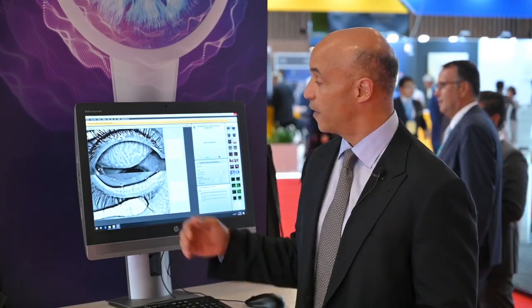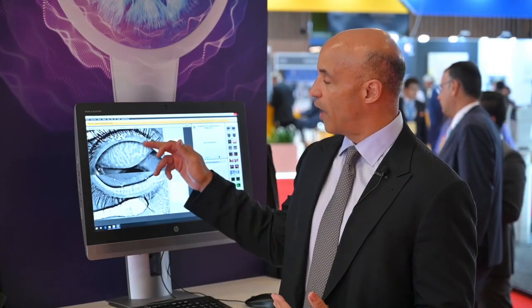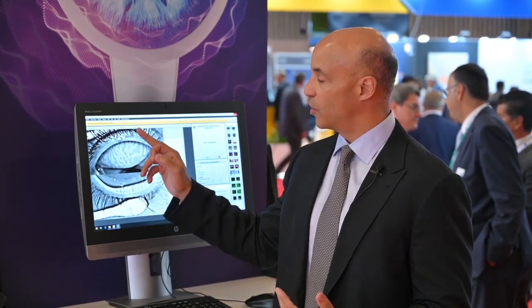After I get that, then I'm looking for treatment. I do a lot of different treatments, most specifically intense pulse light for dry eye. With intense pulse light, what I'm seeing is after several treatments, where these Meibomian glands are dropped out, you might see them come back. And where you see these irregular Meibomian glands where they start to curve or don't have a straight line, as these patients get better, you see a nice, crisp, straight line, and then you start to see the glands get better.